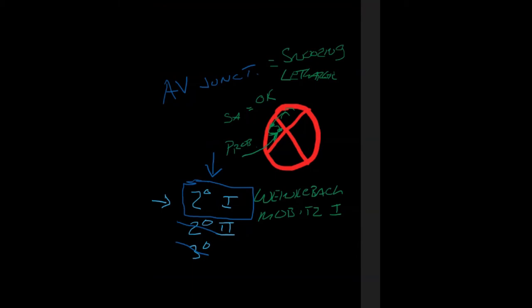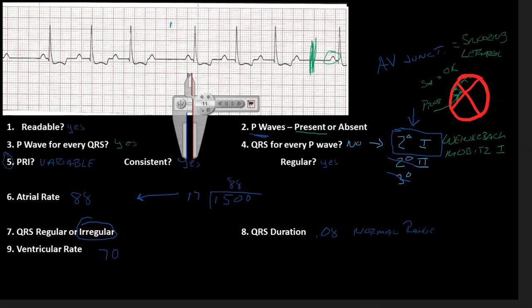It occurs consistently over time, and under the definitions of a high degree heart block, this is a relatively lower one. So this is a second degree type 1, and that's why they would consider it a lower one. It's typically one that does not progress to a second degree type 2 or a third degree heart block right away. So again, take a look at your patients, and hopefully this gave you some insight, and now you understand a little bit more about a second degree type 1.